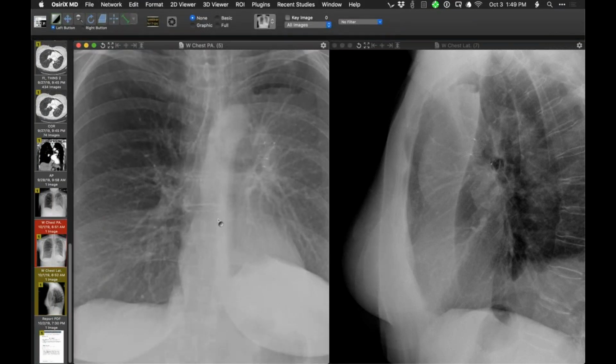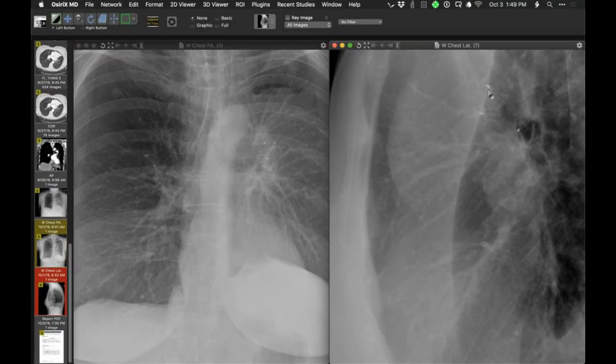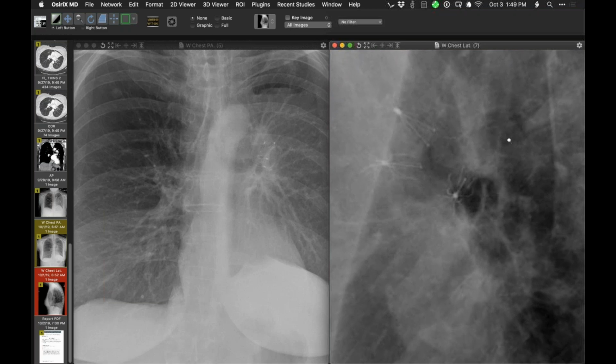They put them in the right direction, right? They didn't put them in backwards or anything. Oh, no, I don't think so. No, they're pointing in the right direction in that sense. I don't think one can actually deploy them in the wrong way. You have to get them in with the point in the right direction, and then you inflate them, and you see these things inflate, under bronchoscopic vision. So that's my diagnosis so far, and then I'll let you guys know what happens.